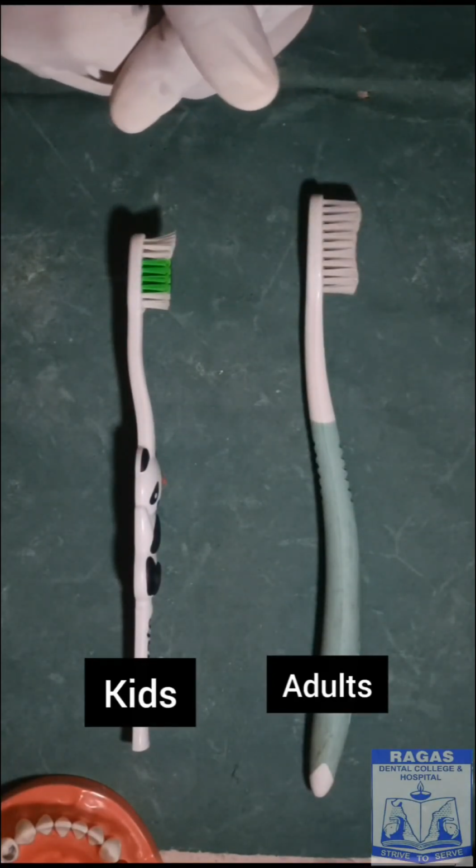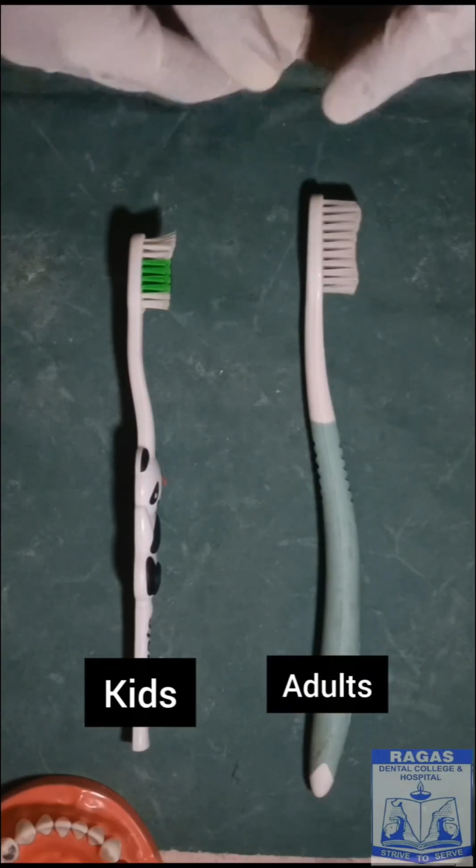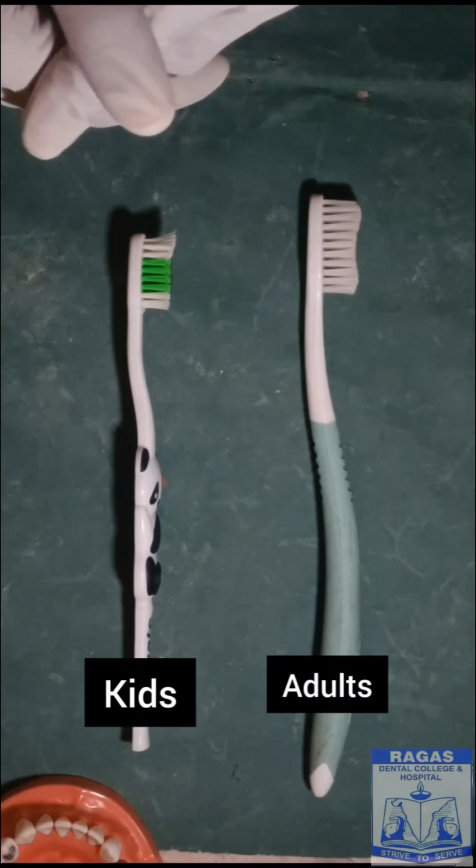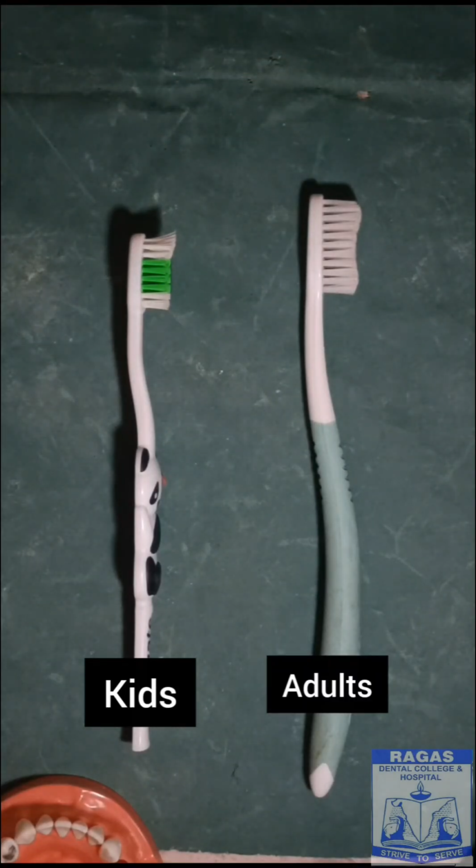Small head is recommended for children. Large heads are usually not recommended because they don't have greater access. Medium head are usually for adults.